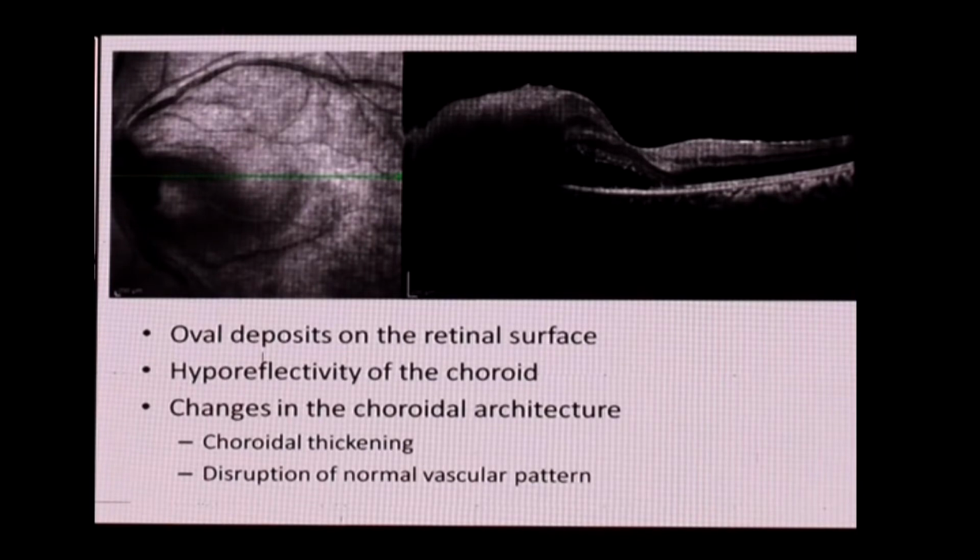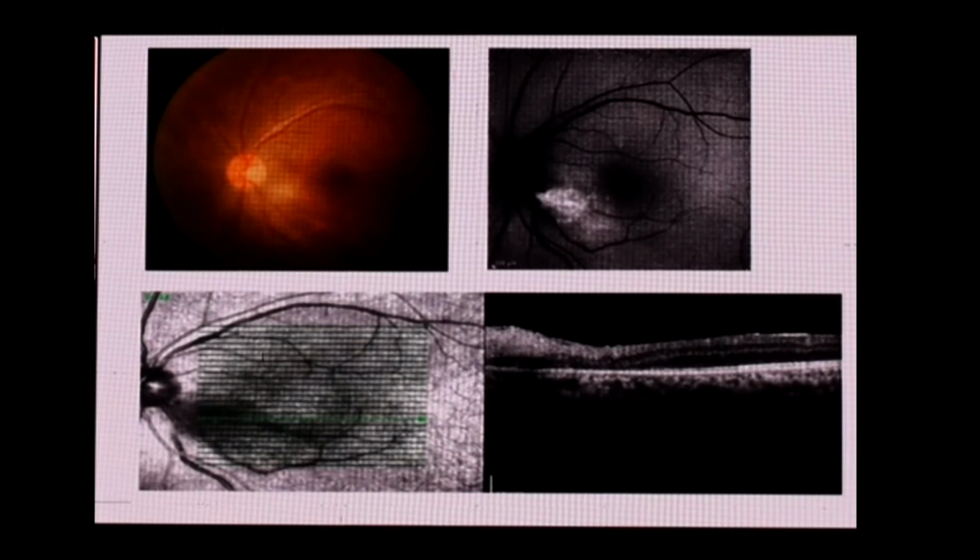When we look at the pathology, you have chorioretinal involvement in patients with toxo, so the changes in the choroidal architecture are probably justified. Here you could use the infrared to delineate the retinitis better. Here again the choroidal architecture is starting to come back as the lesions resolve and the fluid resolves, but the outer layer looks relatively okay.